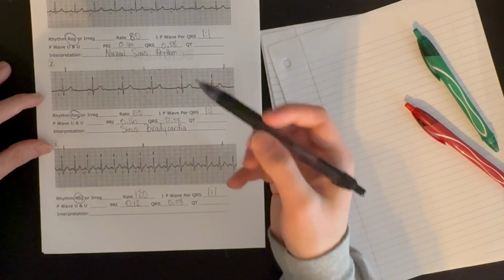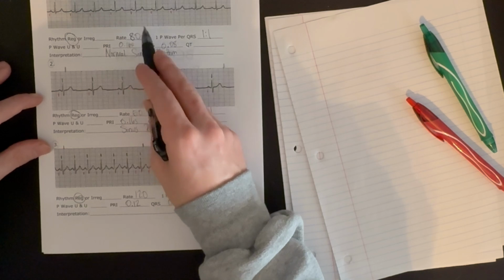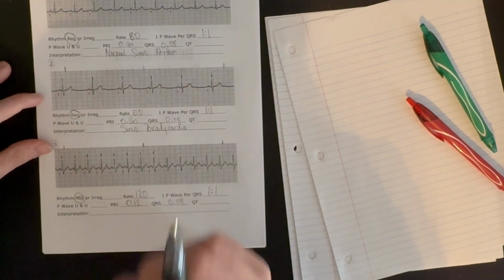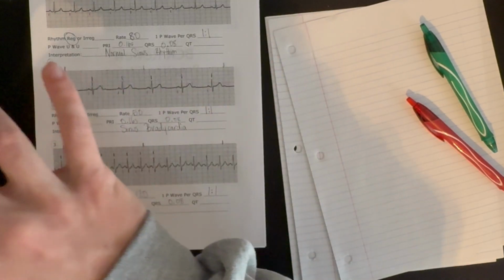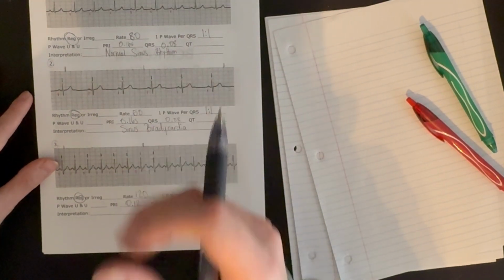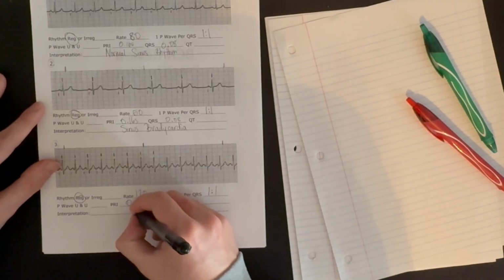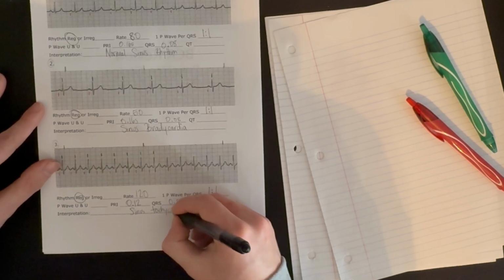And what's interesting is, look at our PR interval. It's still normal, but look how it changed from the first and second rhythms. When we got tachycardic, there is less filling time. The SA node is firing at a faster rate, and so it shortens the timing that the electricity has to get through everything else in the heart before the next impulse from the SA node comes. And so what we see is that our PR interval got a little shorter, but it's still normal. So this is sinus tachycardia.